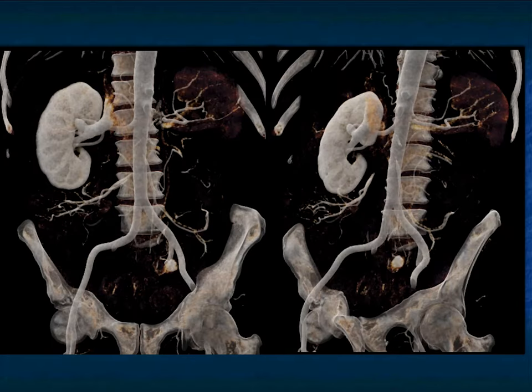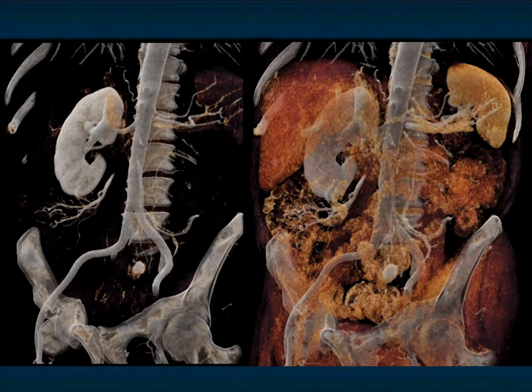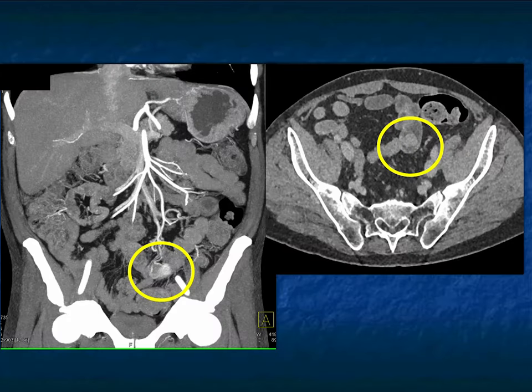Here again, the left nephrectomy and the patient's tumor involving bowel in the pelvis, measuring about all of 12 millimeters. But again, when lesions are vascular, when you do good technique, good injection, you are going to pick up these lesions. You can see the lesion is fairly easy to see here on arterial phase, but as you go to venous phase, okay, there it is. But you may have thought this was some food in bowel or whatever. You may not have called that, and I don't blame you.